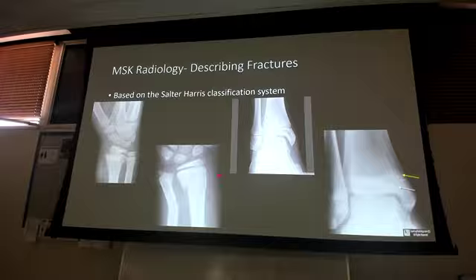If I were to follow the cortex around and draw it, they line up with each other pretty nicely in almost all of these. But when I look at the first one, I don't have it lined up. The epiphysis, or the radius here, is slipping off.